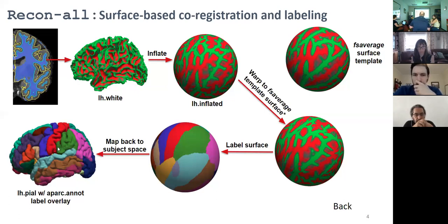In terms of overall co-registration, I still think it would be pretty good, because you have so much other information. Instead of just doing something like an MNI space, where you're trying to match extents and do rotations, you have a lot more information because you've got all of these landmarks all around the surface to use.